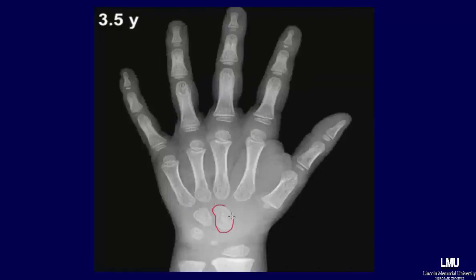Here we have the hand of a 3.5-year-old. Circled are the ossification centers, 2 carpal bones, and the epiphyseal plate of the radius. Note when we go to the metacarpal bones that the epiphyseal plates are on the distal metacarpal bones until you get to the thumb where the epiphyseal plate is located proximally. Now I will just circle the rest of the epiphyseal plates on this 3.5-year-old.